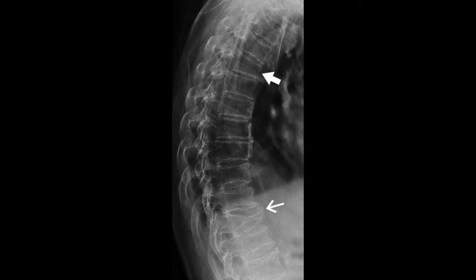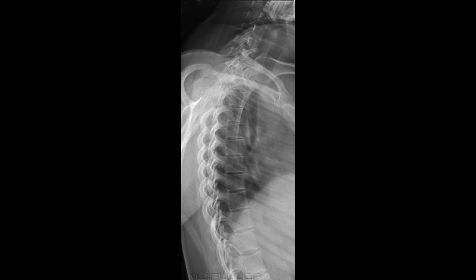It properly demonstrates intervertebral discs, intervertebral foramen, vertebral bodies, the lower spinous processes, clearly seen through the ribs. T3 to T12 is properly demonstrated, and soft tissue and trabecular detail. For this image, it would be on a 14 by 17 lengthwise, and the breathing instructions would include a breathing technique. The anatomical body plane the CR was entering was the midcoronal plane for this swimmer's view.